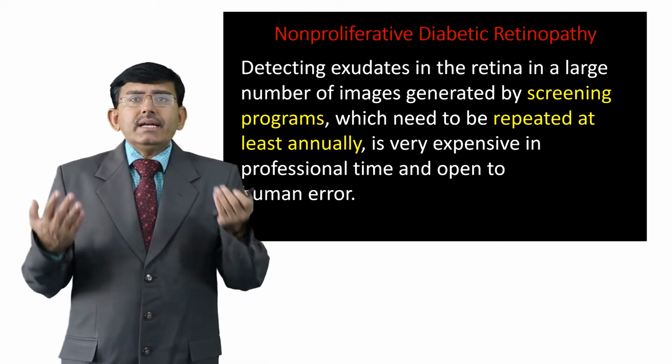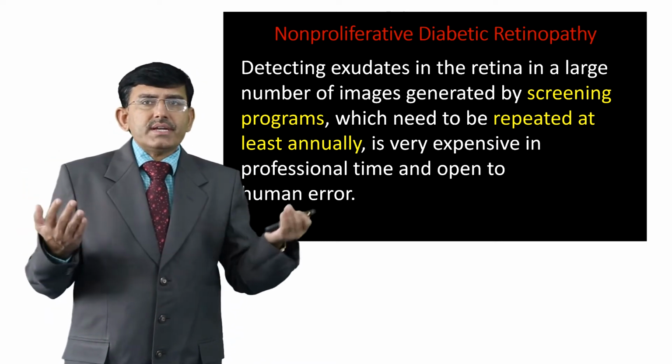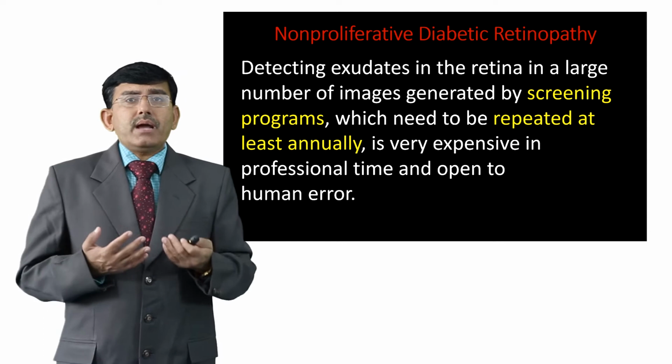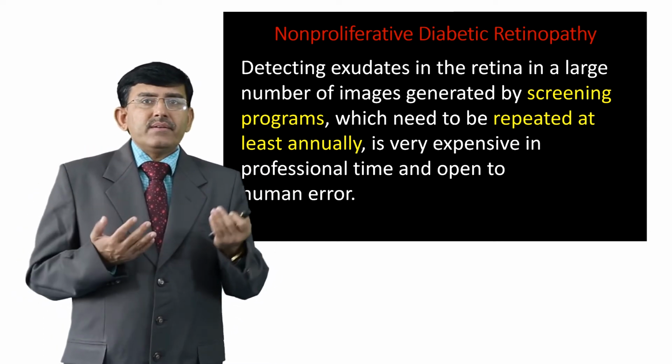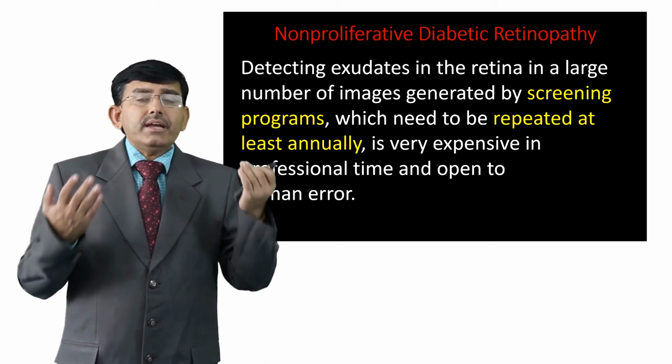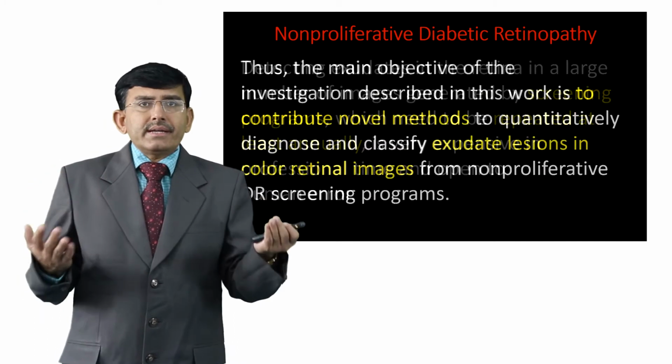Detecting exudates in the retina in a large number of images generated by screening programs, which need to be repeated at least annually, is very expensive in professional time and open to human error.